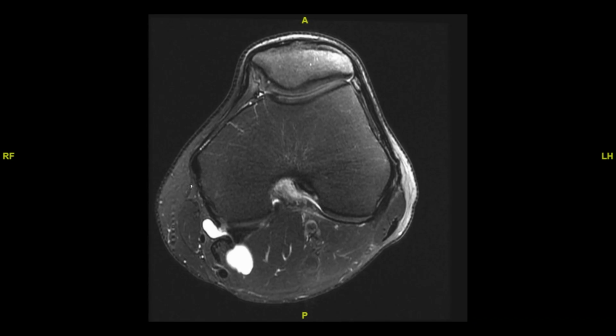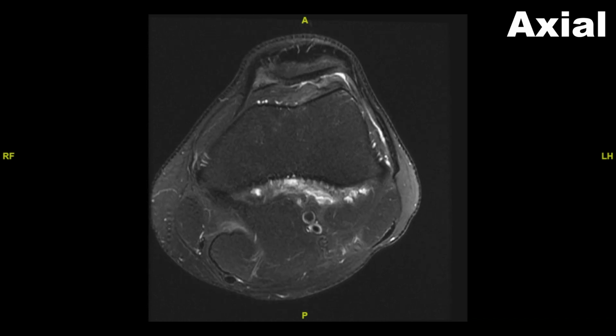Okay, so on this last sequence of images, we are on the axial view, which is just a cut right through the middle of the knee, middle of the leg, almost like chopping a log in half and looking at it on end. And so this is the front of the knee, and this is the kneecap, the patella, and this is the thigh bone behind it. And so we can move through the knee just like this.